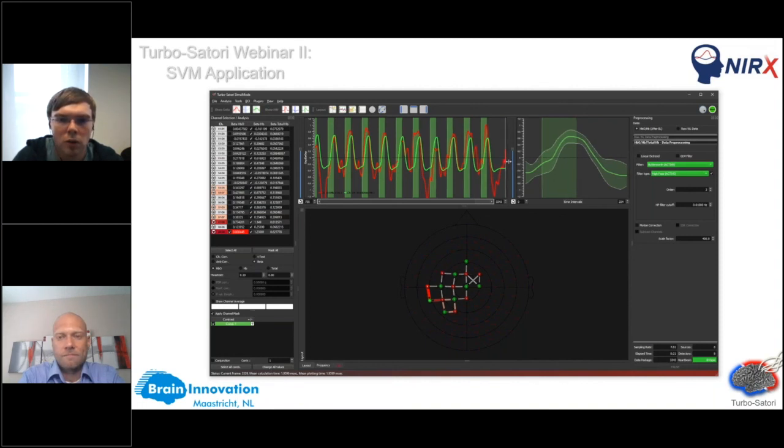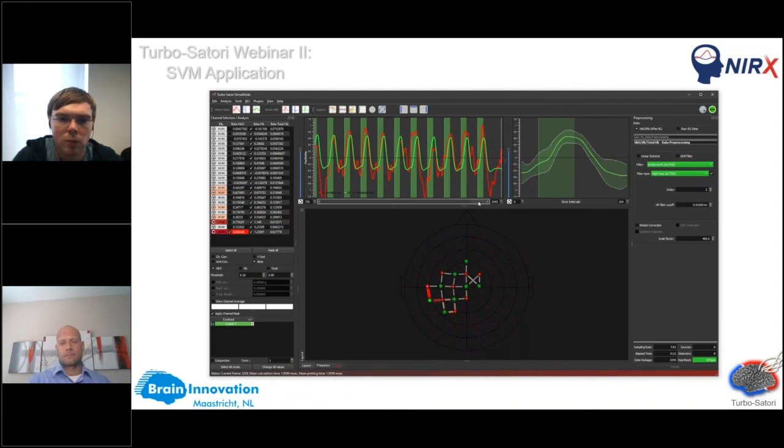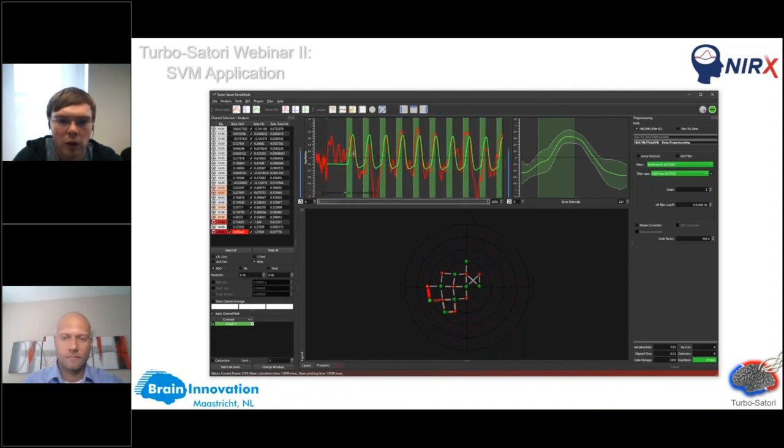But what you can do is integrate a specific trial, for example, in the beginning of your neurofeedback session, where the participant is just performing the task for 1 or 2 trials, and then you can use, for example, the beta to define your maximum % signal change.